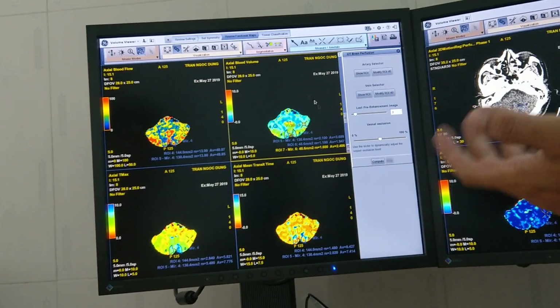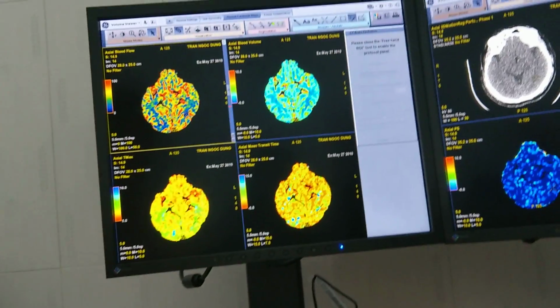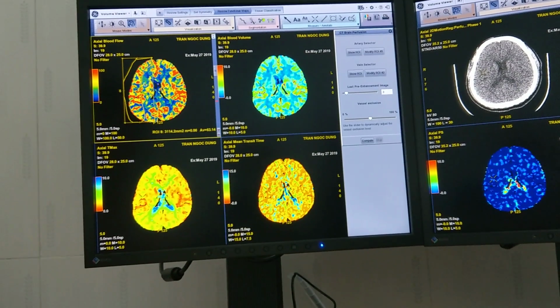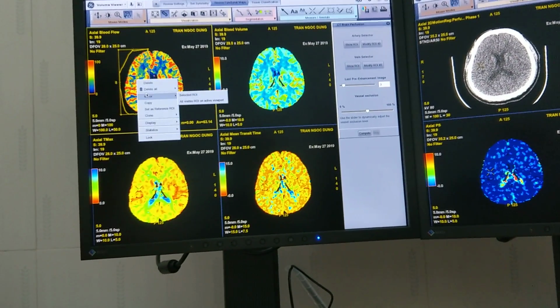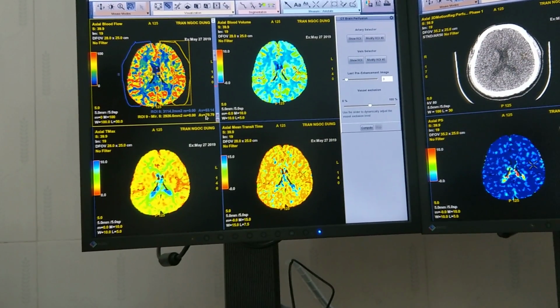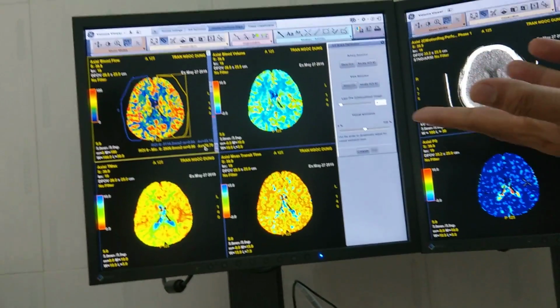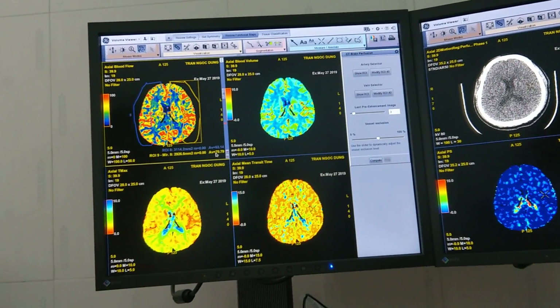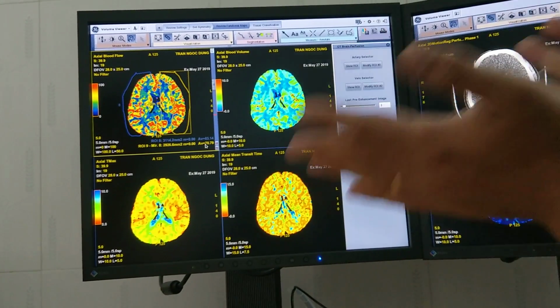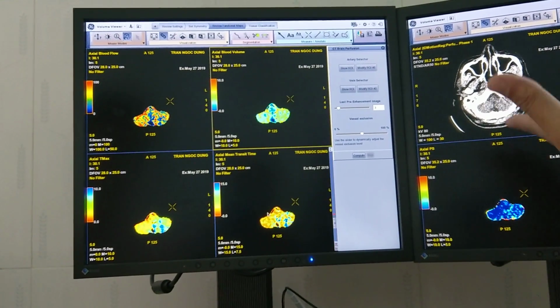You can compare many ROI if you want. Some places they do the whole thing like this. They do the whole white matter, then they compare. So they compare the whole white matter sometimes. So it depends. But this map is basically for looking at qualitative, not quantitative. To look at the color. If there is a color different, like this, so that's the only thing.